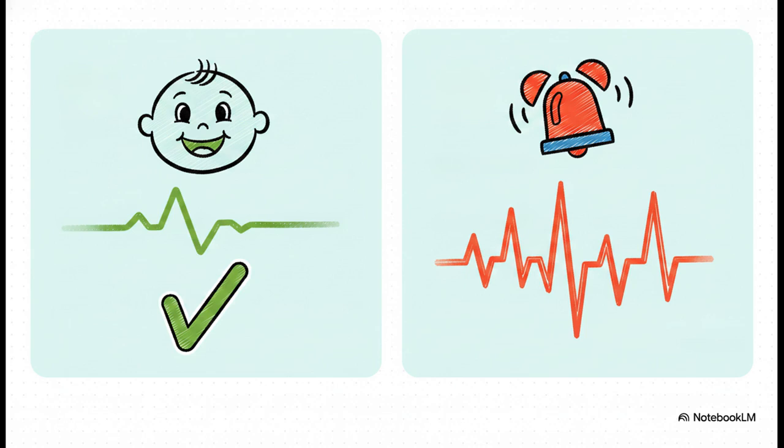But this contrasts sharply with Category 3, which essentially screams unexpected fetal acid-base status. A Category 3 tracing means you've got absent variability combined with recurrent late or variable decelerations or even bradycardia. There's no waiting around here. It requires immediate intervention and preparation for an emergent birth.